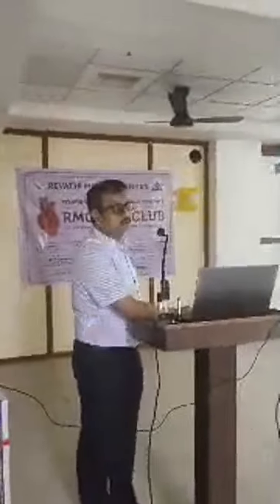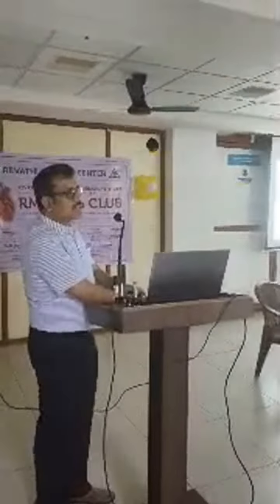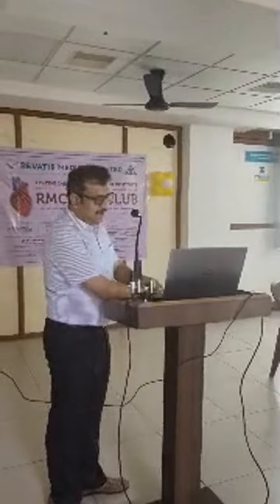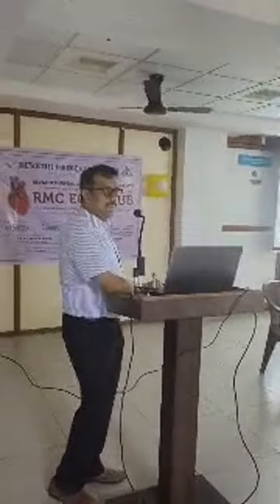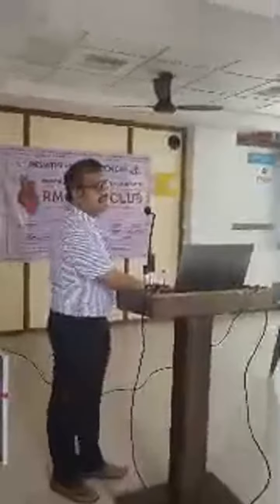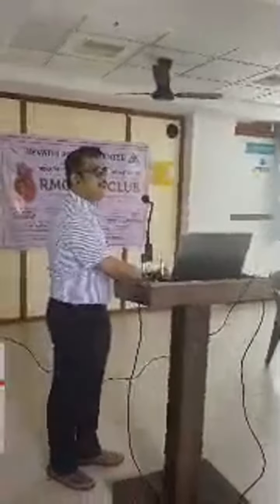So very prolonged QT. When the patient went to the ICU, the patient had torsades. Torsades was the reason why the patient had a cardiac arrest. So there are multiple reasons why you will have a QT prolongation. The patient had a potassium not very low, around 3.6, and magnesium was pretty low, 1.2, and TSH was 15. Most of the patients in a critical care unit tend to have multiple reasons for a longer QT. This patient has 3 reasons why her QT is prolonged.